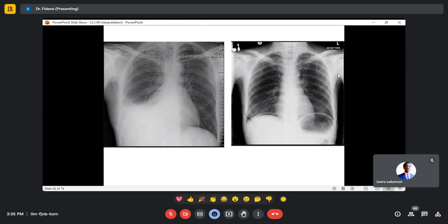I think by now that's all. Okay, so your conclusion? My conclusion is this: this patient, we deal with these free airs. Pneumoperitoneum. That's your conclusion. Yeah. So my question is, is this PA or AP?